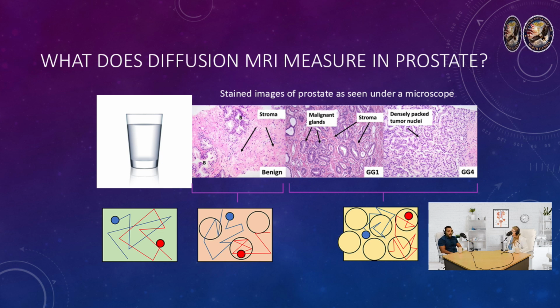That's great. As you get to more malignant tissue, all that tissue is more compact. And because of that, the water has a more tortuous path, and it can't move nearly as far in the same time frame. And so it will appear like a bright area on the diffusion-weighted image. Right. Great. So we'll go to the next slide.